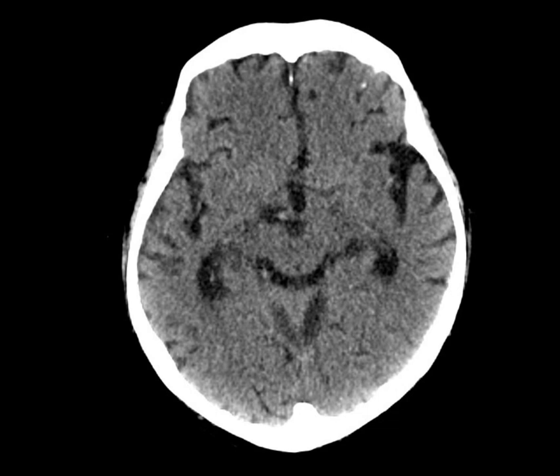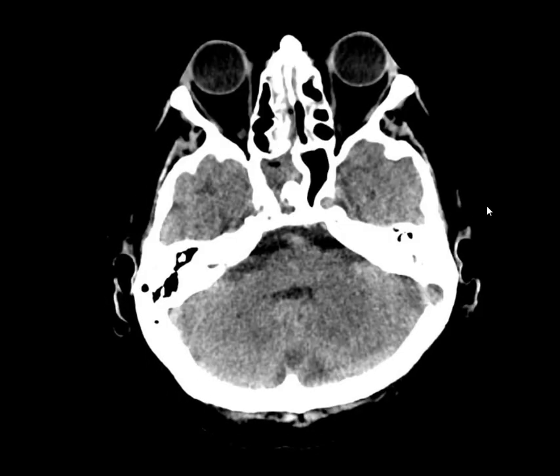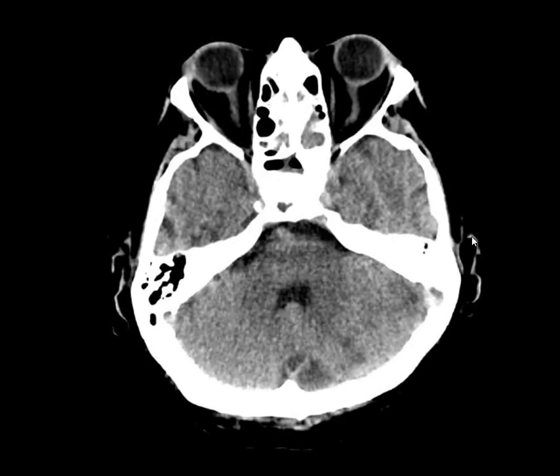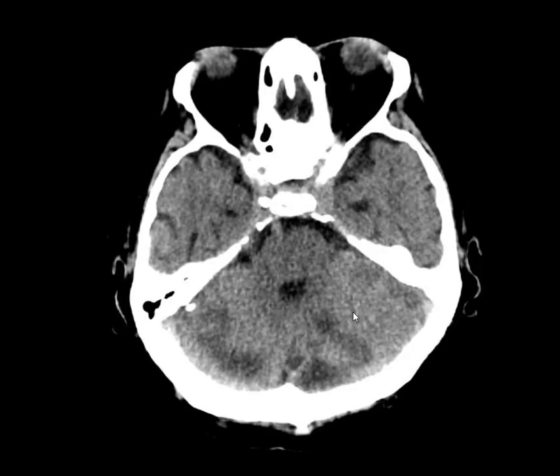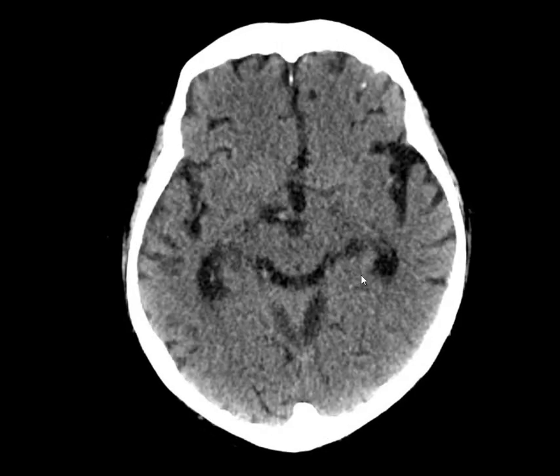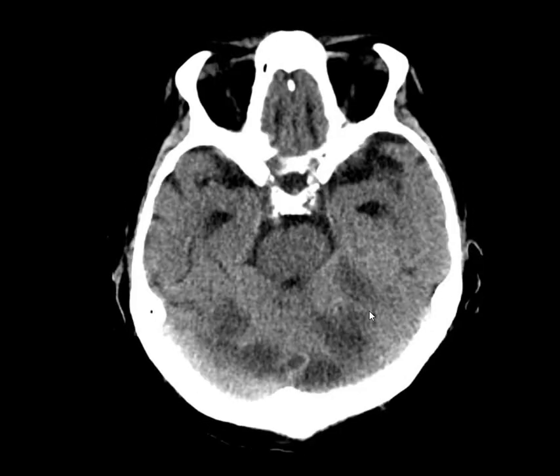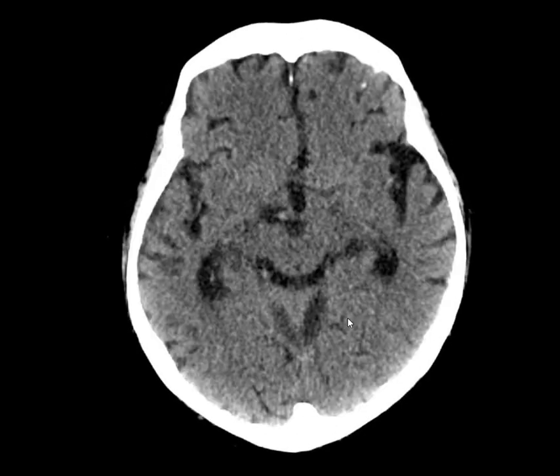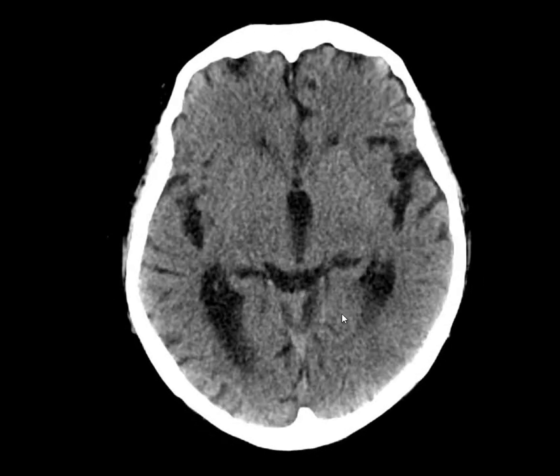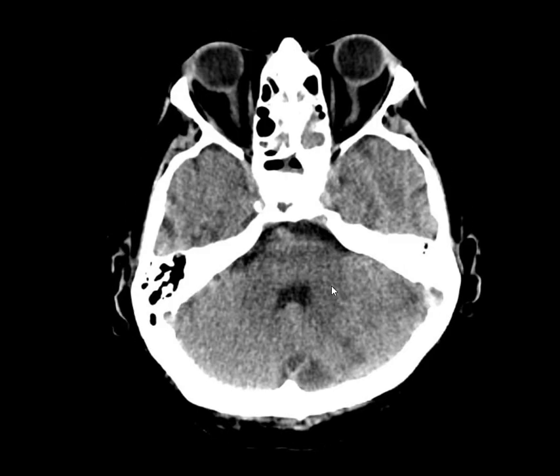So here was a male patient who presented with history of trauma. So obviously we'll be looking for EDH, SDH or any fracture. As I was scrolling down, I could see area of hypodensity, and it's definitely abnormal, and it is not as hypo as our CSF. So in case of trauma, maybe we can think of subdural hygroma, chronic subdural hygroma, but this is not the site for it.